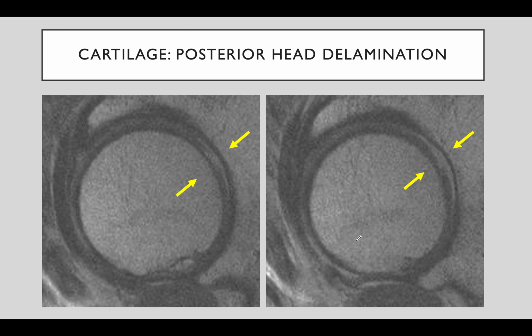After we look at the ligamentum teres, we turn our attention to the cartilage. If you do good high resolution imaging, you will see the articular cartilage very nicely on both the acetabular and the femoral side. So here is the acetabular bone, here is the femoral bone, and between these two, this gray area is a combination of cartilage of both the femoral and acetabular cartilage. And you can see that it's gray here and all this way here, and gray here and all this way here, and this is the femoral and acetabular cartilage.